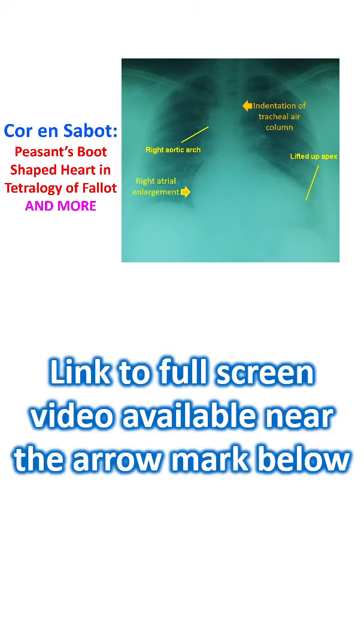inferior wall myocardial infarction. The lung fields are oligemic due to the right ventricular outflow tract obstruction in Tetralogy of Fallot. Tetralogy of Fallot is the commonest cause of right aortic arch in an adult.